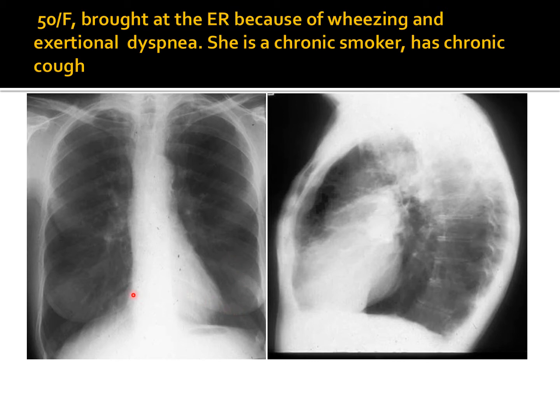The cardiac shadow is slendered out, secondary to the pressure of the air. Okay, it is slendering. You lose the convexity of the left cardiac border as well as the convexity of the right cardiac border because of the pressure of the hyperaeration and the increased air in the lungs. The heart shadow is compressed because of that pressure, so it becomes a slender heart or a sexy heart, as some radiologists will call it.